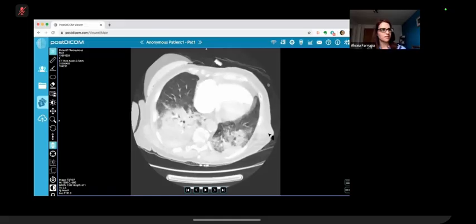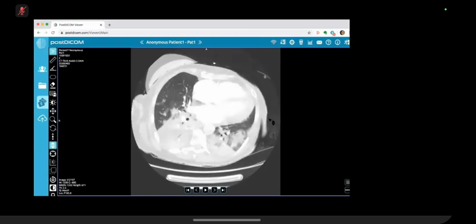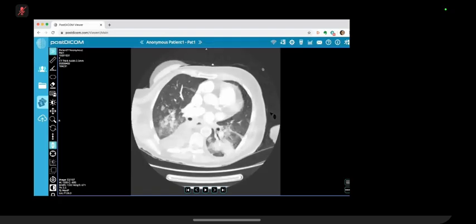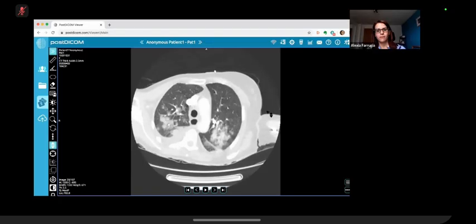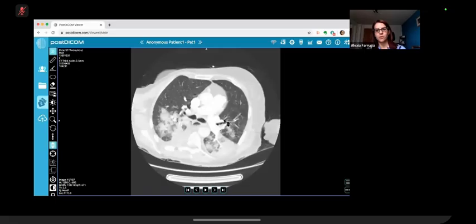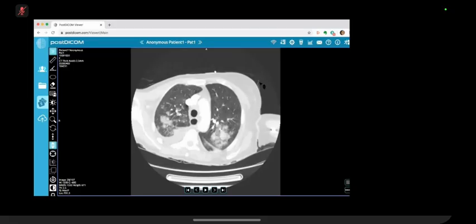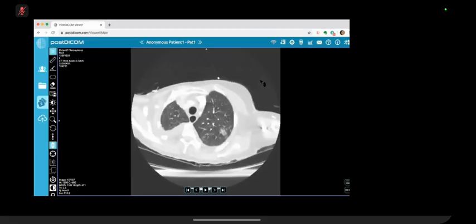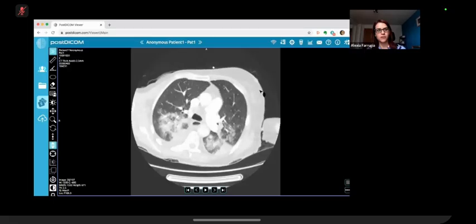She's just had surgery. She's in theatre recovery. Yeah, the history is not in keeping with PE. This is not the time of pulmonary embolism. Also, if you window accordingly, there was no PE. I agree. Yes. So this is very short or immediate post-operative sequelae, right? Yes. She's still in recovery.